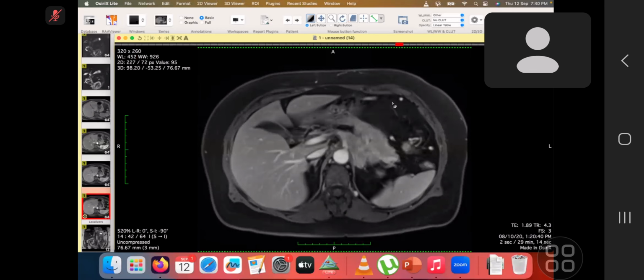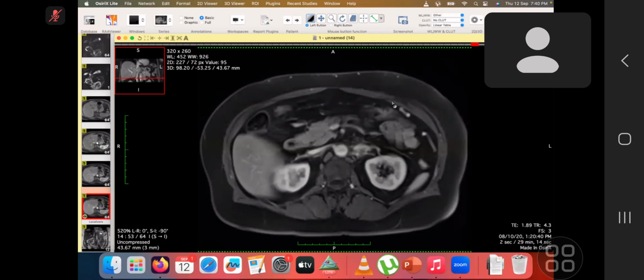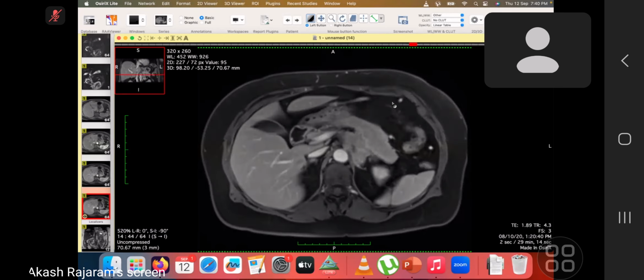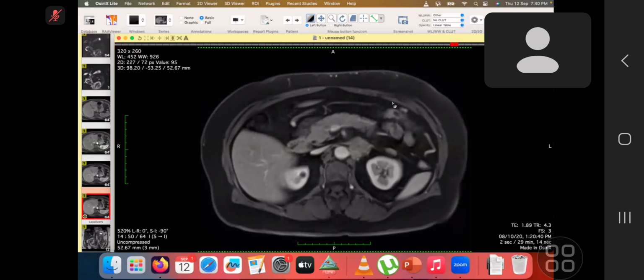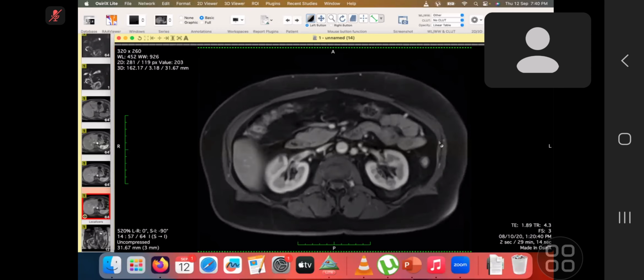necrosis. So this looks suspicious for malignancy, though this could be a primary or metastatic lesion. So I would retract my previous diagnosis and reconsider it, because this is quite an infiltrative-appearing lesion encasing the vessels as well. And pheochromocytomas are more likely rounded with homogeneous enhancement.